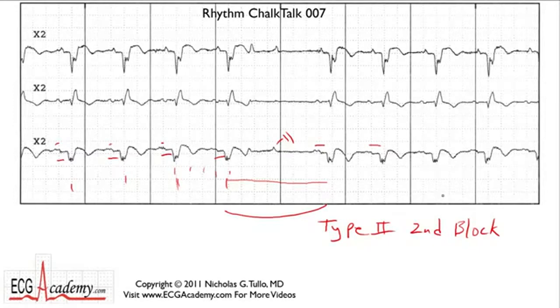Well, that's not the whole story. And we'll have to go back and talk about how to look for small details. Remember, first you look at the forest, then the trees, but it's the small details that will give you the answer every time. So what does the ECG look like? You've got this P wave that has high frequency signals because it looks kind of spiky, and then you've got T waves that have a very low frequency signal content, and it looks very smooth. And if you look at these T waves, I beg your pardon, they look very smooth. And you see this one here.